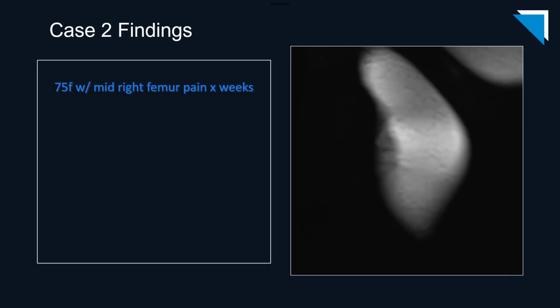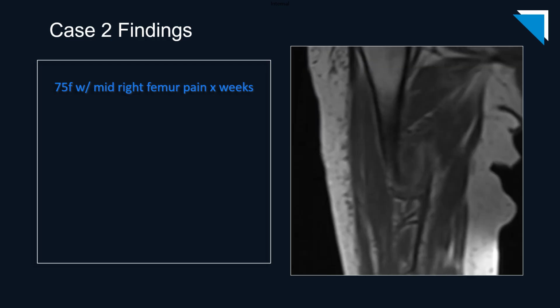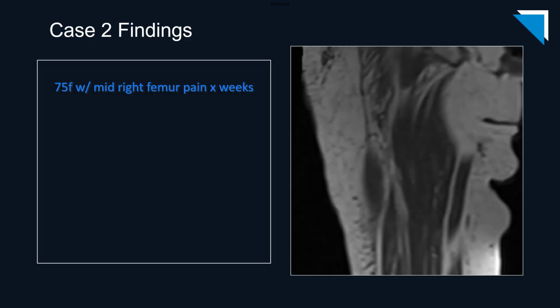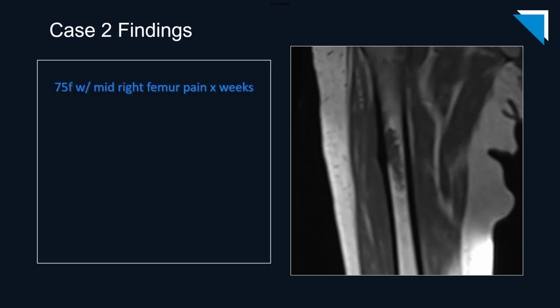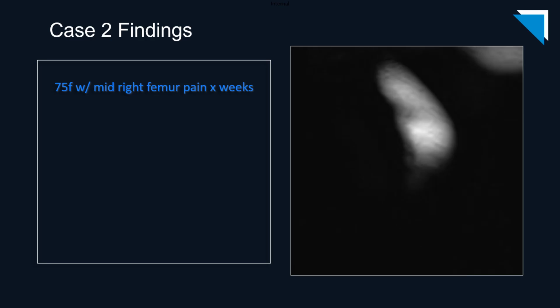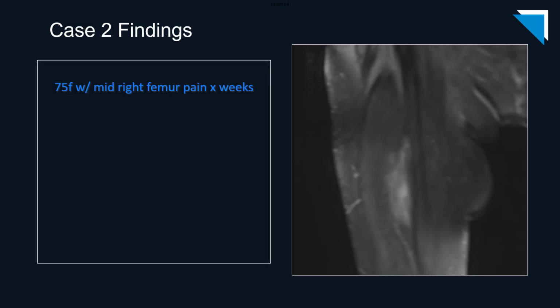Here are the coronal T1 weighted images. And finally, the coronal fluid sensitive images.